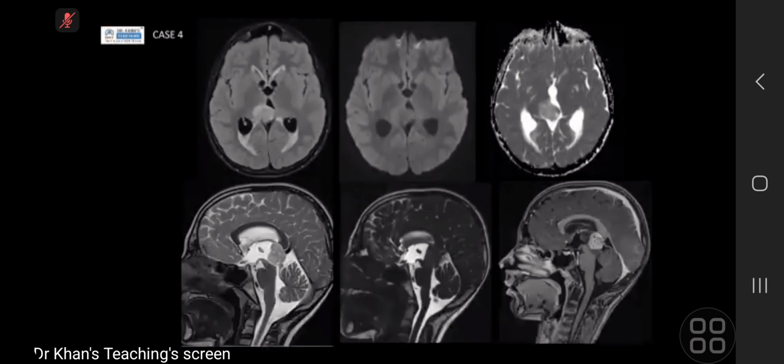Okay, next case. Okay, I have been provided multiple sets of the MRI. The first one on the left is an axial FLAIR image. It's showing there is a mass in the region of the pineal body, which shows high signal with a rim of edema surrounding it, and also there is a transependymal high signal in the periventricular region. Could this be from increased hydrocephalus, increased pressures, and this one FLAIR. This is okay.